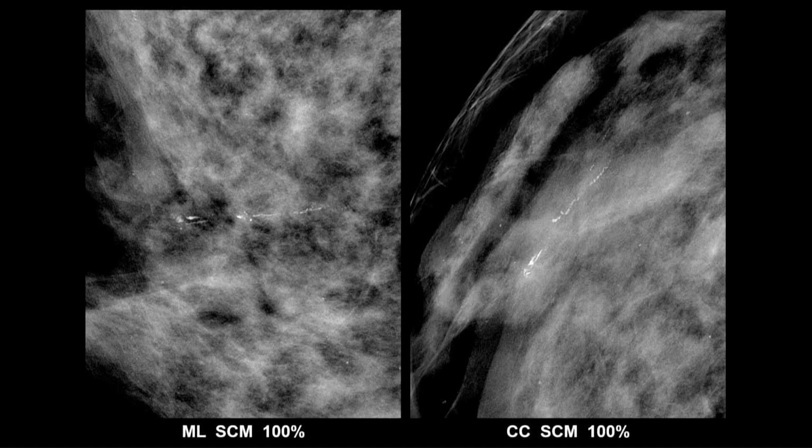And if that's the case, you need to replace the tube. Okay, well, at any rate, we see them better. The morphology of the individual calcific particles is also linear. It's not just linear distribution, it's also linear morphology. And that's very suspicious for malignancy. So this is going to be suspicious. It may not be highly suggestive of malignancy by RADS 5, because seeing that without any other findings is probably not enough to get you to 95% likely malignant, but it certainly would be a 4C in terms of how suspicious within category 4.